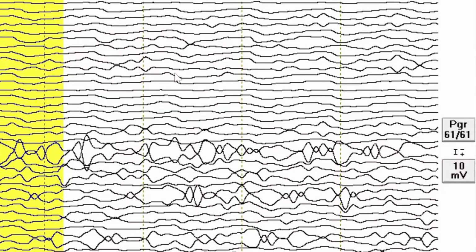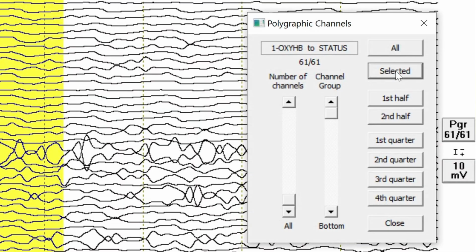What you want to do is create an ELP file that would then put the holders on the head in the right positions, using a Patriot or a Fast Track from Polhemus. But then again, it wouldn't be called PGR, which stands for polygraphy channels.